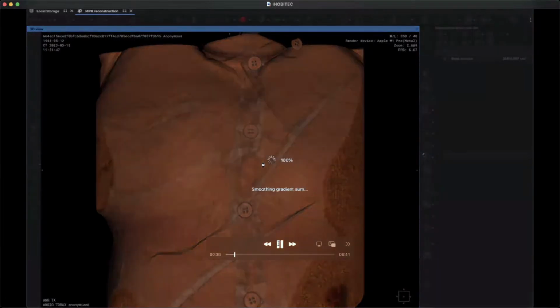This whole process took about 3.5 minutes using a MacBook Pro 16 with M1 chip. My MacBook Pro has 16 gigs of memory. It took a little bit less than 3 minutes on the PC desktop, but the PC desktop is a more robust one. I have 128 gigs of memory, DDR5, and the specs are very different from the MacBook one.